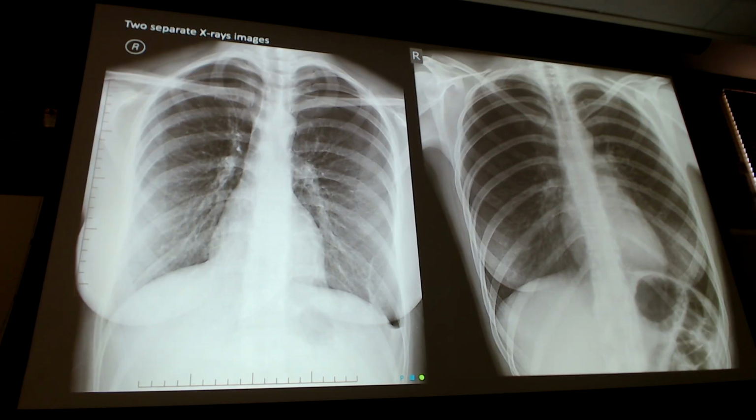And then even on this patient here, you can see her scapular edge. Yeah, no, she did a great job. You can see a little bit of scapula right in there, and a little bit here. See that little superimposed line that goes over the ribs and comes down? So you've got your pneumothorax, but then I still have this other radio-opaque line. That's that scapular edge. I'm going to do it on this side too so you guys can see what I'm talking about. So we've got our pneumothorax here, right?